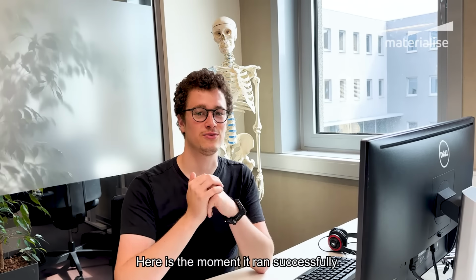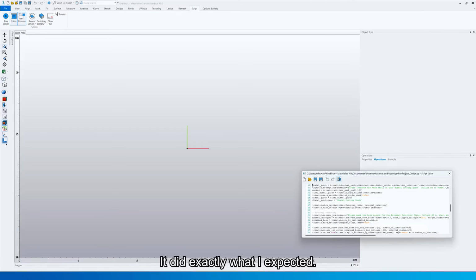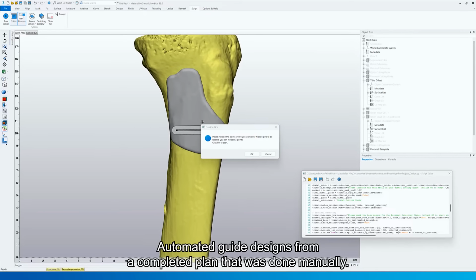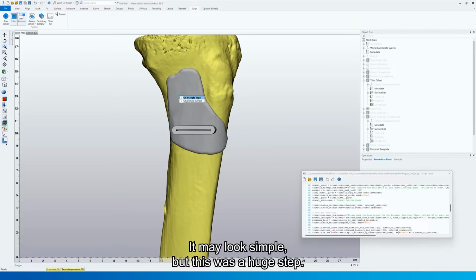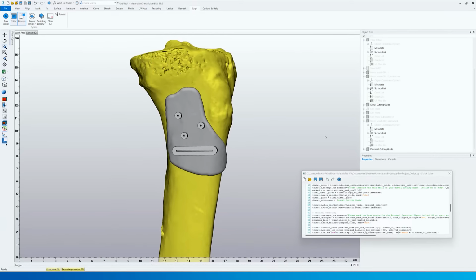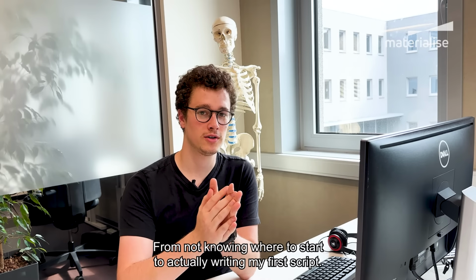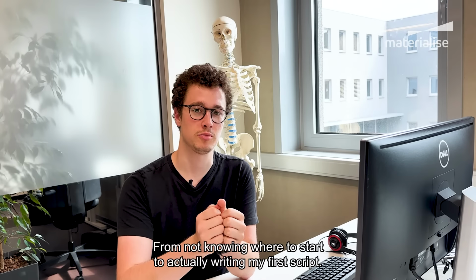Here is the moment it ran successfully. It did exactly what I expected. Automated guide designs from a completed plan that was done manually. It may look simple, but this was a huge step. It felt amazing, from not knowing where to start to actually writing my first script.